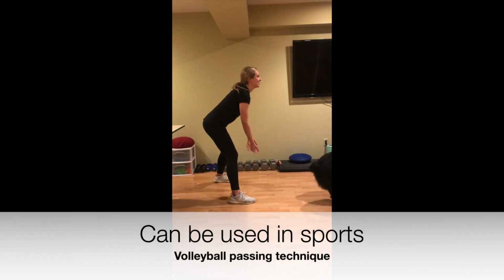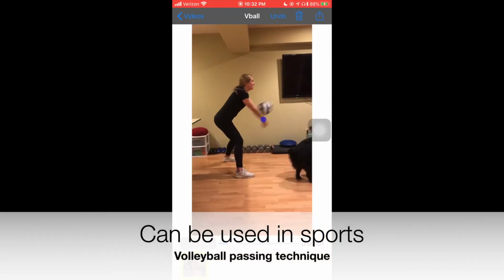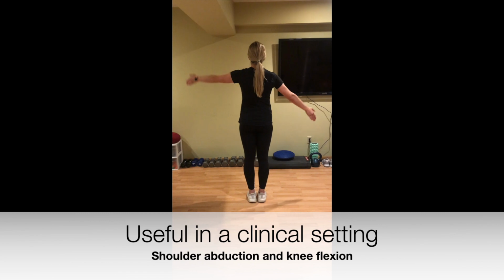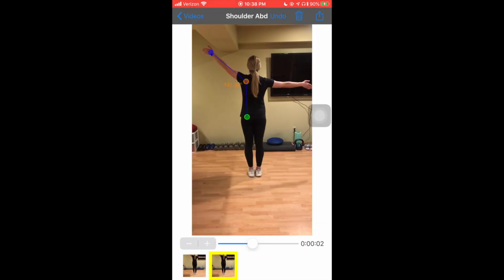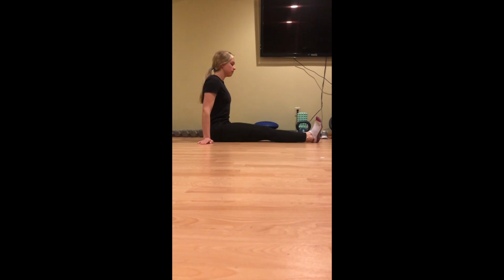The Angles app can be used in sports to assess technique and show the athlete how they can improve on their skills. This app can also be used in a clinical setting, such as a physical therapy clinic, to quantify range of motion of a joint through a motion or to show a patient their improvements over time.